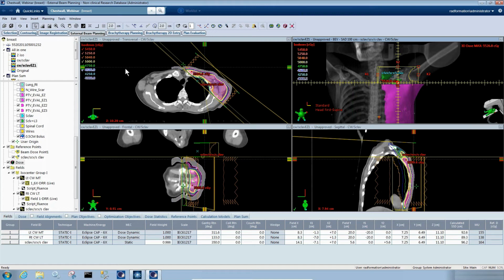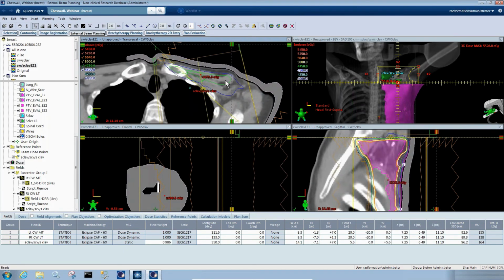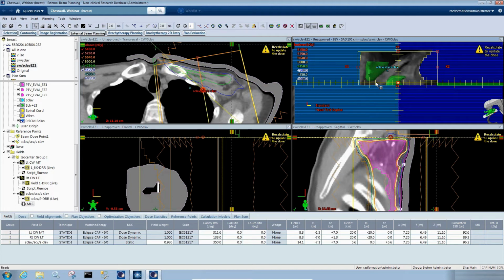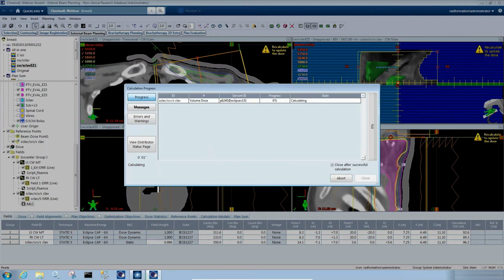I'd like to add an additional tip and trick, actually it's just a trick. A lot of you may already know this, but I'm going to go ahead and show it anyways. When you get a plan back from EZFluence and at your match you get one slice that, yeah, you know what, this needs a little more dose. An Eclipse trick that I learned is that you can go into your supraclav plane here. I'm going to go ahead and turn on the MLCs, and you see how outside of the block, that first MLC here, outside of the block or the open field, is closed. What I'm going to do is take that MLC and open it up. What this is going to do is provide just that little percentage of leakage through the block, but not the MLCs, right?